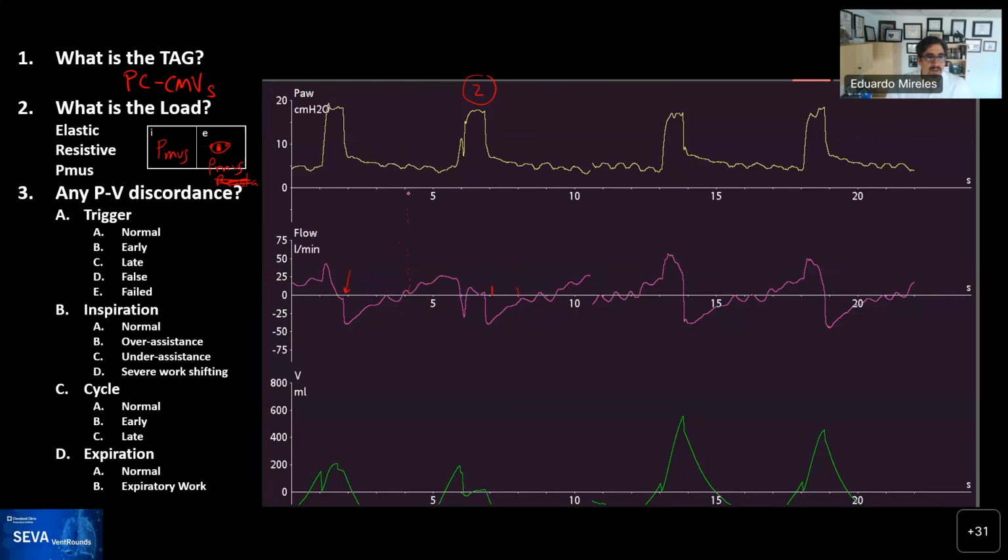Then the system pressurizes, and it's like the patient actually was now trying to exhale, and there's a little bit up, and then the breath ends and the patient exhales. So essentially there's minimal to no breath being delivered during the period of time that the patient is getting the breath. The patient got the breath before that. And this one was incomplete. This was a terrible picture, but this one over here tells the story even better.